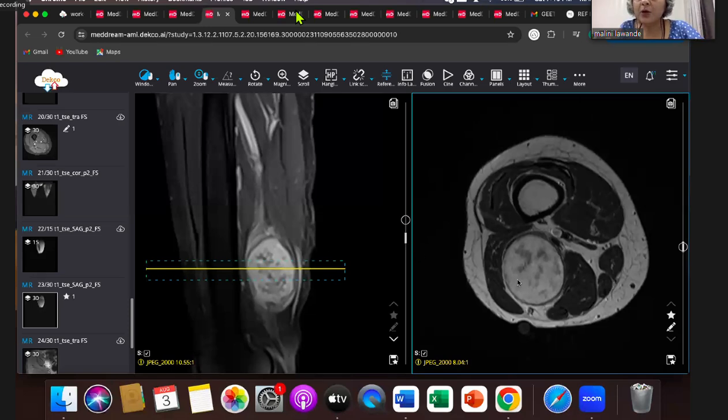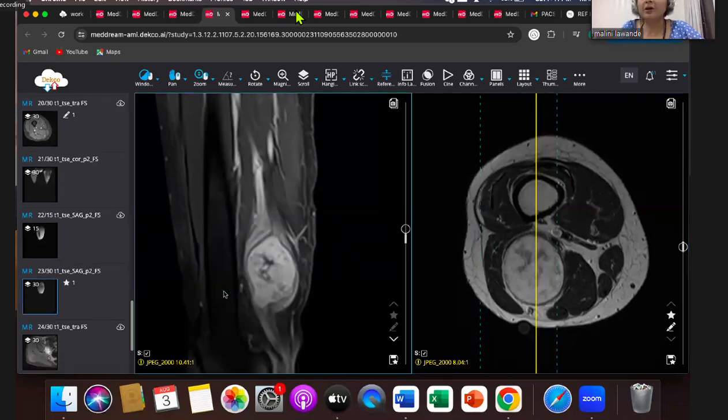And between neurofibroma and schwannoma, you may not be able to distinguish. Diffusion, yes. There are articles which talk of looking at the ADC value, which will be lower in more malignant lesion. But again, there can be an overlap. So to me, I'll call this a nerve sheath tumor. If this is something which has increased recently in size, suddenly the patient has developed pain, they have to exclude a malignant peripheral nerve sheath tumor. Just on imaging, I may not be able to say. If it is invading adjoining structures, very infiltrative, then I'll say it's a likely malignant peripheral nerve sheath tumor.